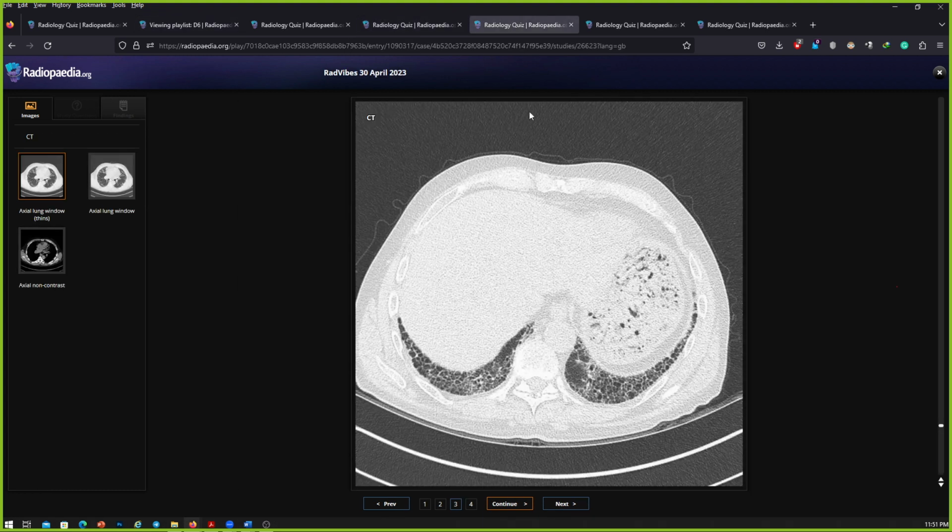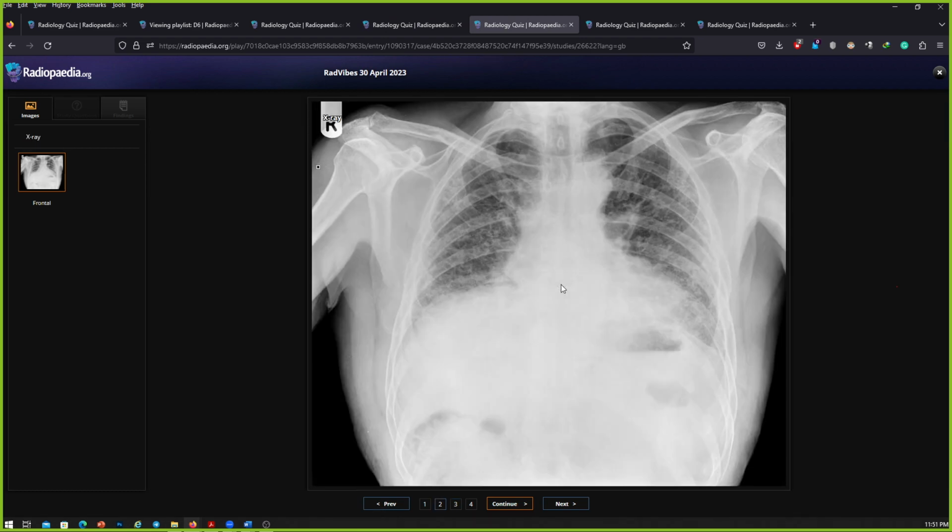I just remembered that I did not discuss the radiograph of this UIP, usual interstitial pneumonia case. Well done. I like the fact that you discussed the lung volume. In any radiograph, the differentiating point between interstitial lung diseases such as UIP and NSIP and the fibrotic lung diseases, and the group of cystic lung diseases such as Langerhans cell histiocytosis and those differentials, is lung volume.